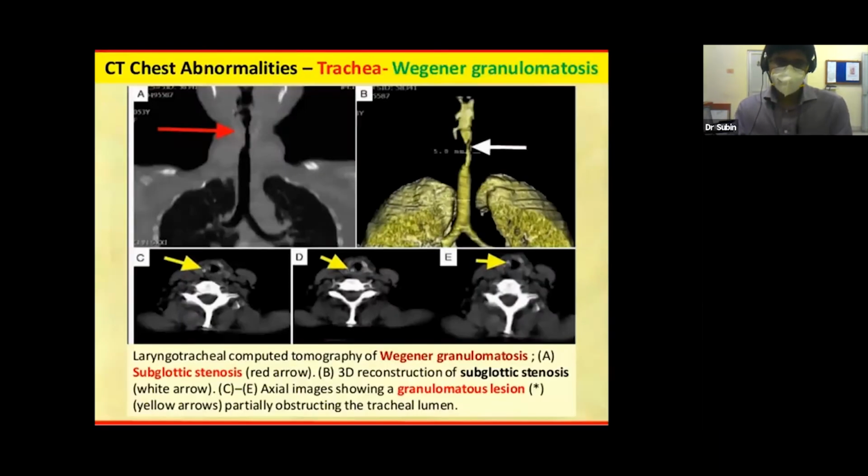All right, so how do we evaluate the CT? Again, just like X-ray, we have a protocol. We'll go through each area by itself. So you can start with the trachea, go down to the bronchus, then see the lung parenchyma, then see the vessels, or whichever way you want. We need to have some protocol regarding it.